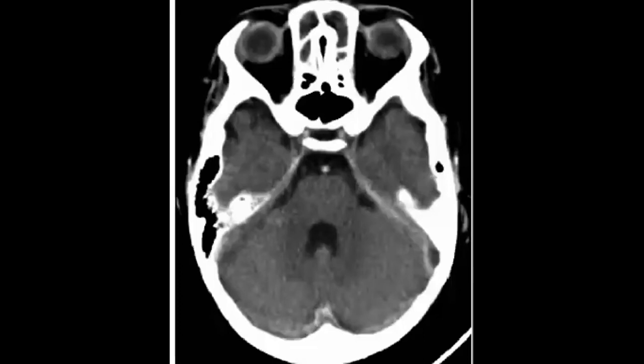It is the same patient. So what do you think about it, and how do you describe it? Start the description as you do in radiology practice every day.